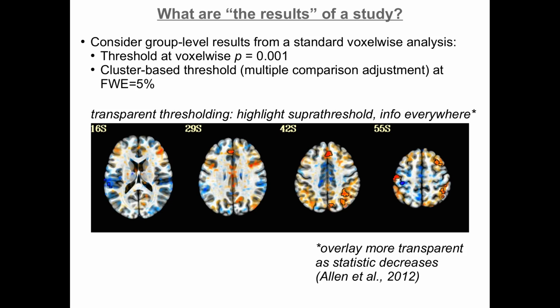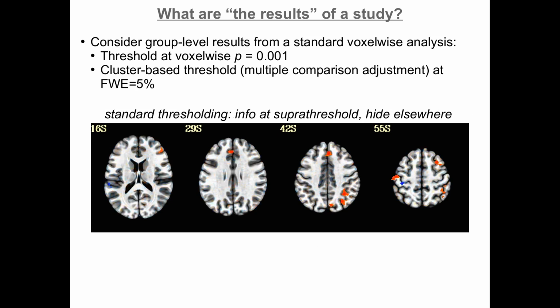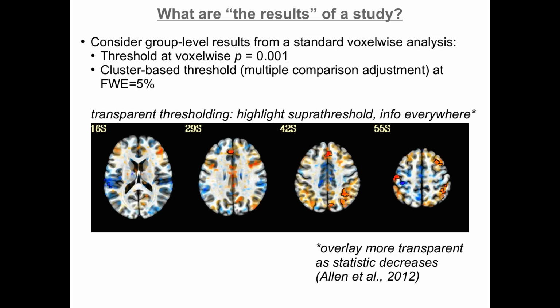Okay, so let me just go back and forth between these two views: the original view and the new view. Original and new view. The thing to notice here is just how much more information is here.